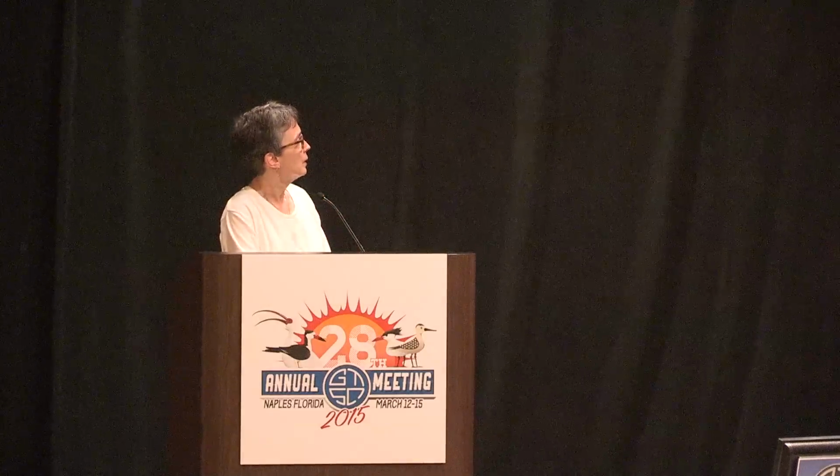And I'll talk about it a little bit more, but I think one of the drivers too with MR to replace CT or to at least complement it is the radiation dose with CT. Being in pediatric radiology, it's always a big thing. What is the radiation dose? What does it mean? Cumulatively, what are people getting? And so I think that's kind of pushing MR forward.